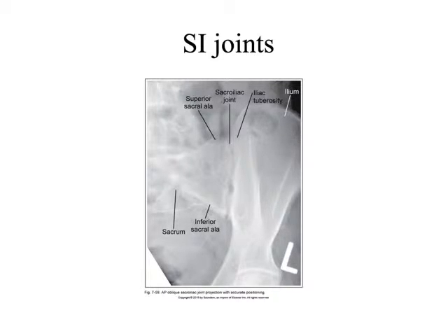So here's an appropriate image of an AP oblique of the patient's left SI joint. And we have the patient rotated to the left side for this image. And then we try to get the marker as close as we can so we can cone in. In terms of looking at this picture and saying what we're seeing, really the name of the game here in this image analysis stuff is to just be able to use the language and the terminology that we've learned to describe what we're seeing on this image.